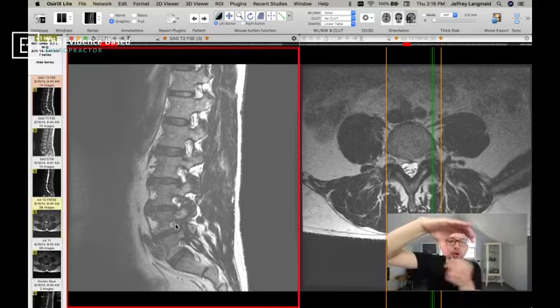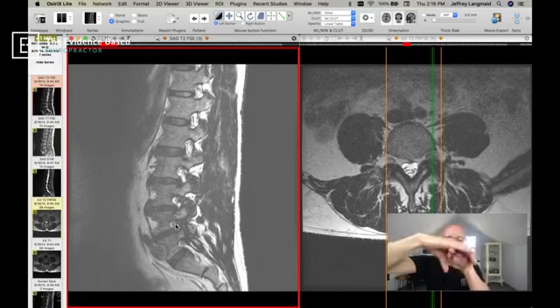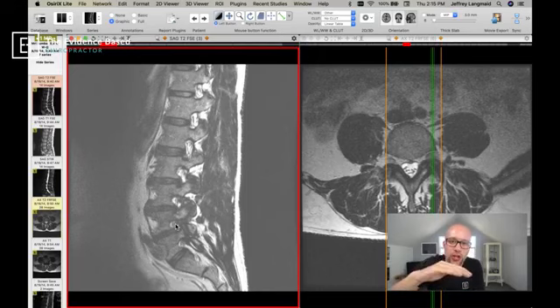And if the disc is poking back into the hole, it can take up a lot of that real estate and push the nerve towards the top. And if the nerve gets jammed and pushed up in the top aspect of the bone and has the disc below it, it ends up sandwiched between the two, causing, drumroll, a pinched nerve, or what we would typically call foraminal stenosis.